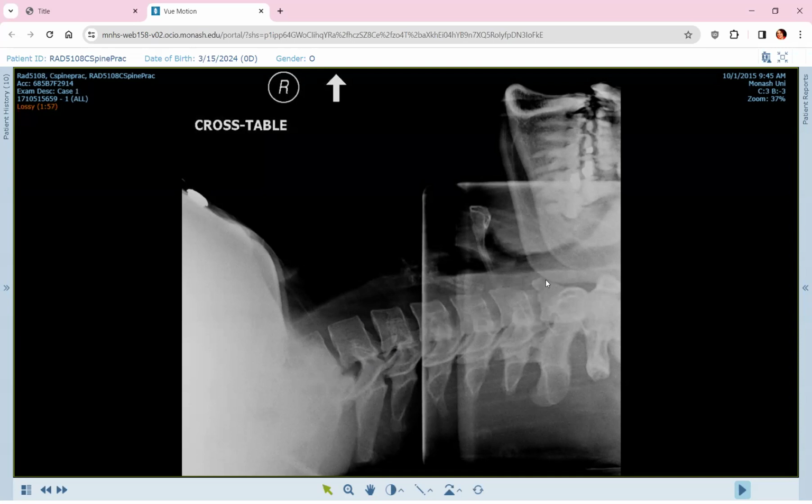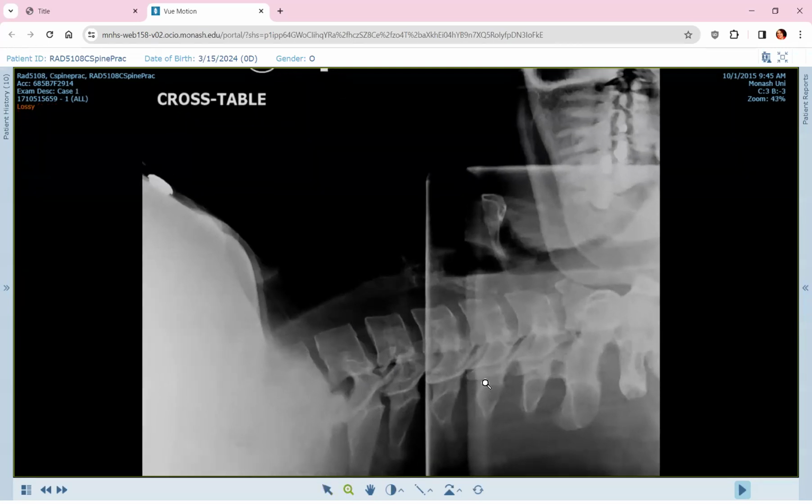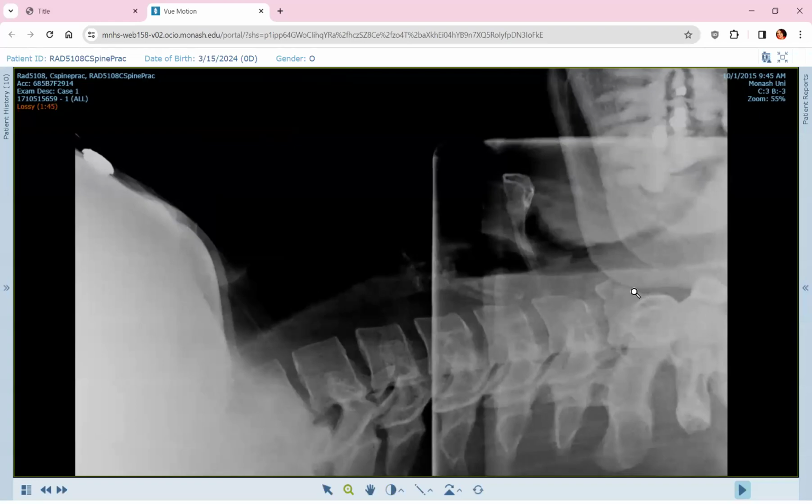And then in terms of the bones, it's quite obvious that there is a fracture, and the fracture is at the anterior inferior vertebral body. And this is a flexion type injury, which is one of the most severe flexion type injuries. So your description here then will be that there is an avulsion fracture at the anterior inferior part of vertebral body 2.